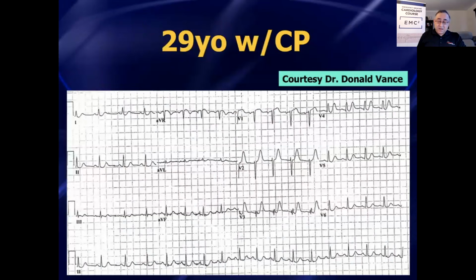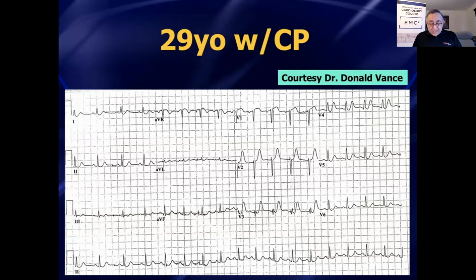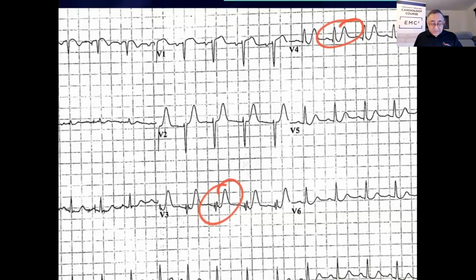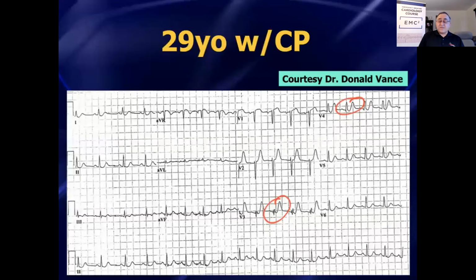That's my usual mantra. And then last case here, this was sent to me by a physician in family medicine, 29-year-old guy who normally rides his bike quite a bit. He came into the office saying that in recent days, he's been having some exertional chest pain riding his bike at much shorter distances than normal. And he was still having a little bit of this chest pain in the office. Here's the EKG that was obtained. And there's clear-cut disproportion, maybe a little hyperacute there as well, but definitely V3. The computer read this as non-specific.